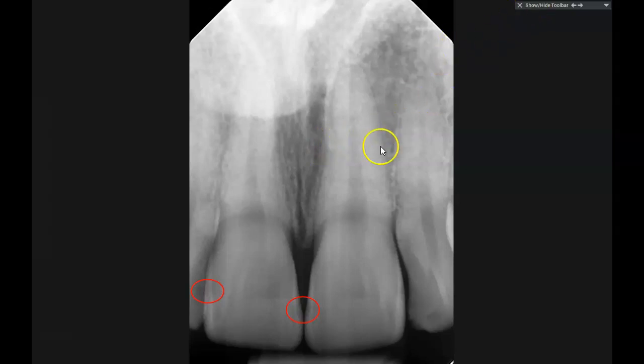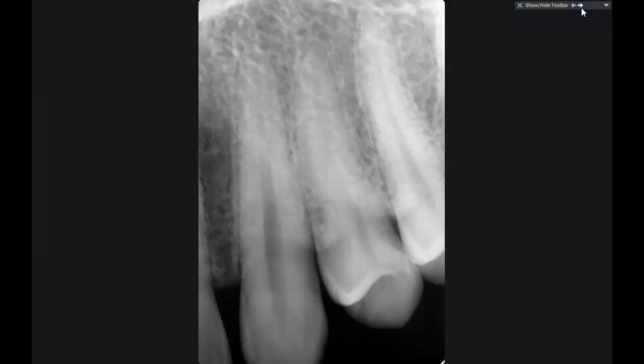It is either this completely full size, totally hijacking your whole screen, showing nothing else, no bar at the bottom, no bar at the top. This has command of your entire computer screen once you go into this mode. But again, you can cursor through.